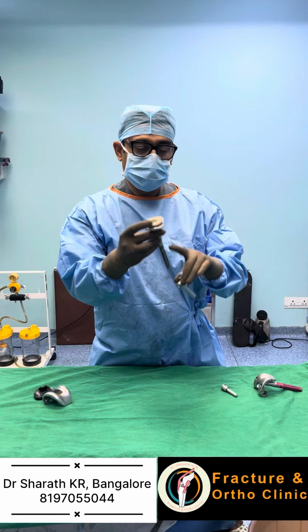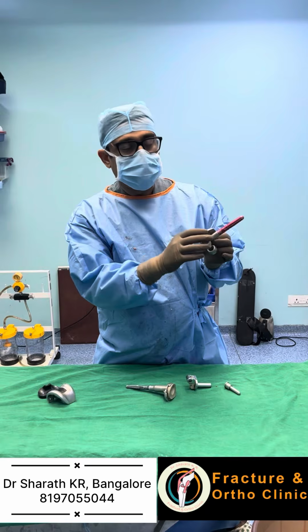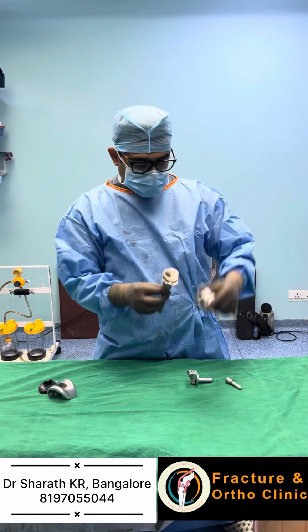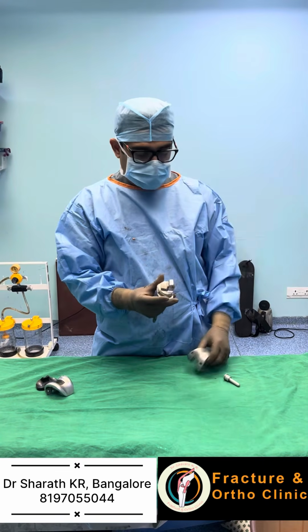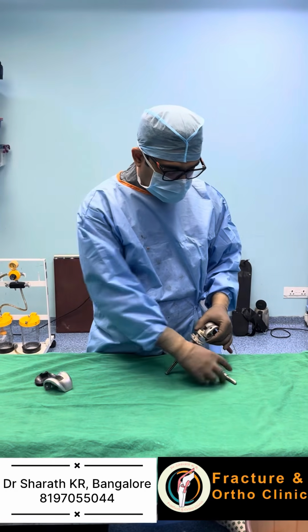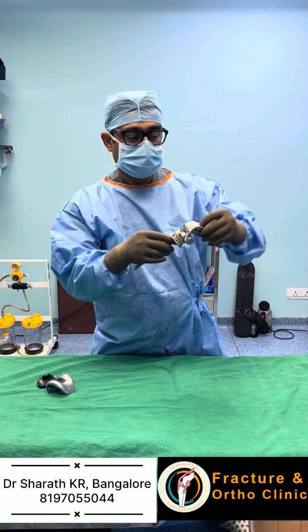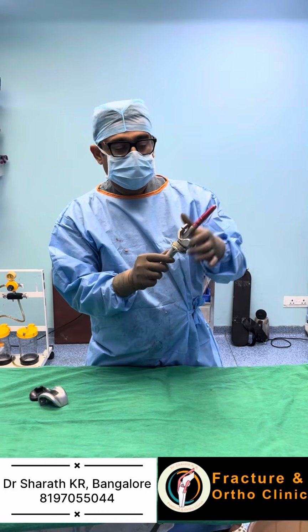this is a stem, this goes inside the leg bone, that is tibia. This is a stem which goes inside the thigh bone, that is femur. This is the femoral component, this is a tibial component, means this is a thigh bone component, this is a leg bone component. And here is, this is called bumper, and this implant when sits like this, we have to put something like a bolt. So when we put the bolt, it acts like this. These both are linked together with a hinge here.